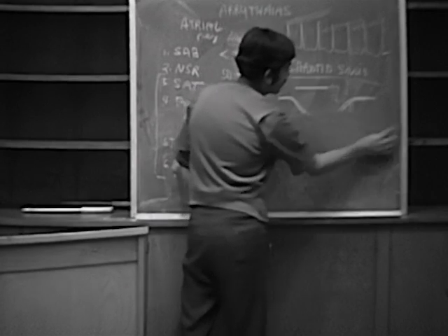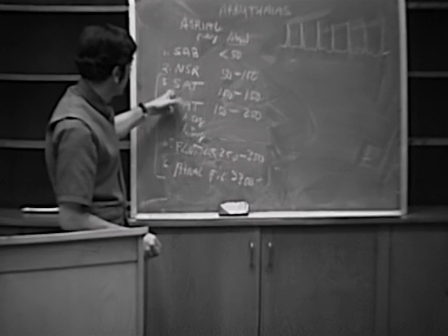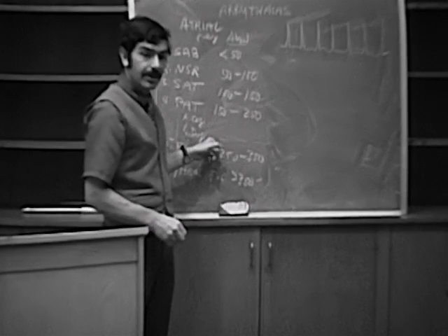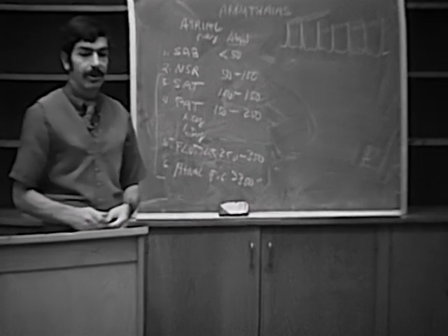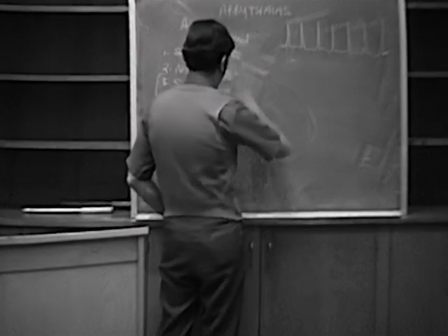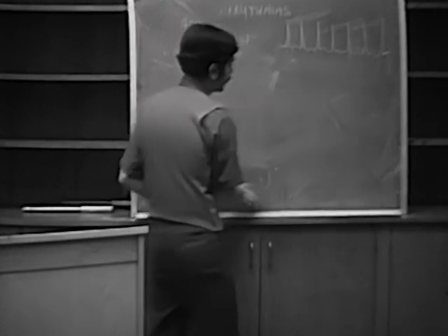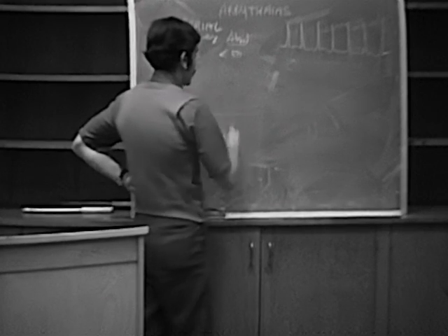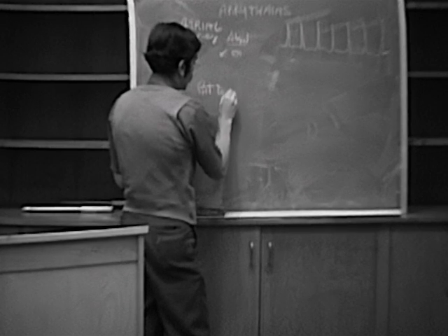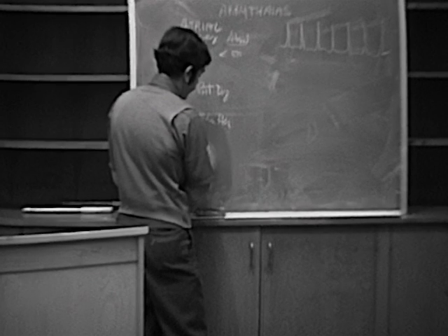Okay, so then you come down. So now we can very nicely differentiate sinus tach, PAT, the regular type, but we have some trouble with these three: the digitalis-induced PAT, the flutter, and the atrial fibrillation. And we have some trouble with those. Okay, now how do we differentiate those? Okay, we've pressed on the carotid, and we've separated out various possibilities. Now, several things we can look at here. Let's make a little table up here. PAT, dig. Then we have here flutter. And then we have fib.